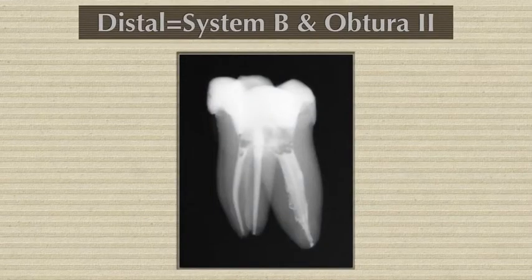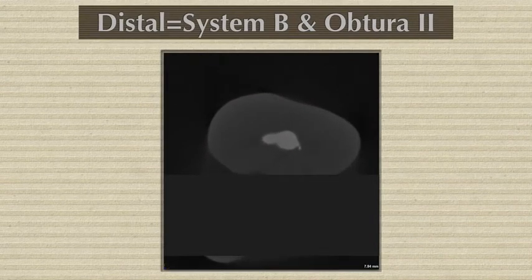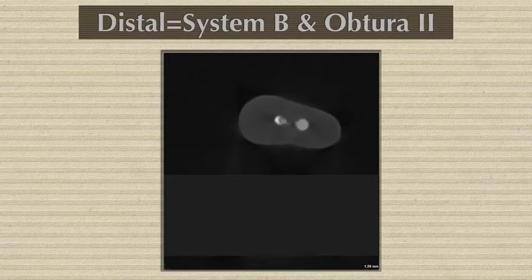Now, let me show you stack images of the distal canal. As you can see, now we are going to start observing some voids in the distal canal. And all of our research is on lower molars because they have curvatures. Look at the voids there. And now the canal will be divergent. And look at it.